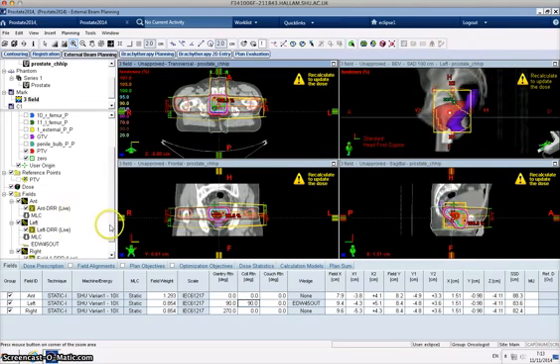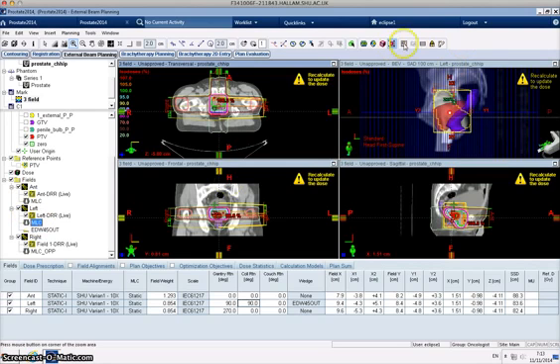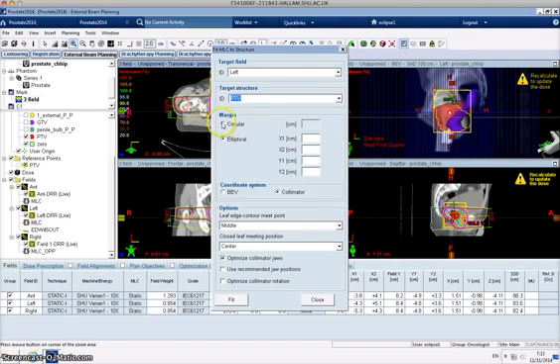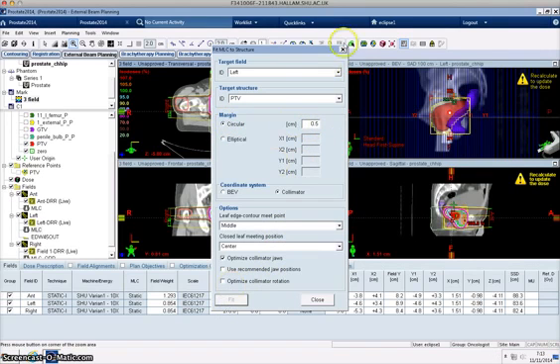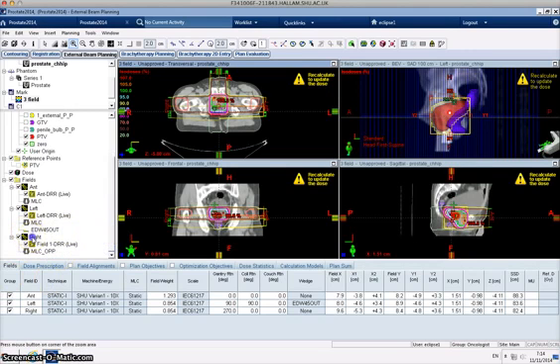So once again, because it's the wrong way round, we're going to reconform our MLC. So on the left field, I'm going to do that, and I'm going to once again put a 0.5 margin around, and what we would then have to do is optimize them again from what we'd done in the past. Okay, so that's that one. We're then going to do the same on the right.